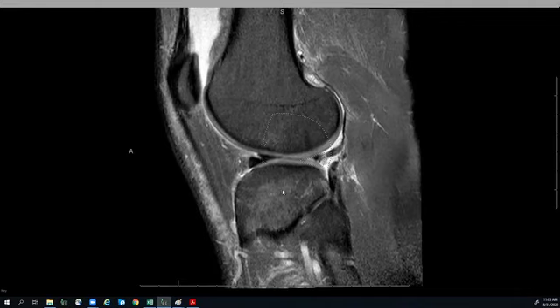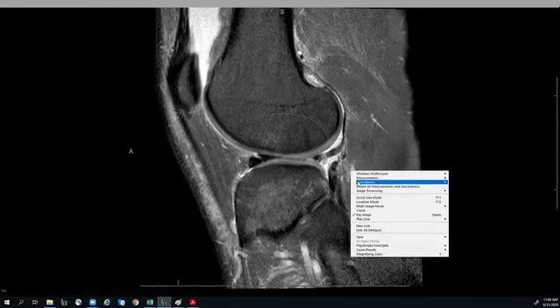Hopefully, the flap tear is more of a complex tear that might be a complication of an oblique tear meeting a radial tear, whereas this flipped meniscus is more of a bucket handle type of tear. I would think about this as more of a bucket handle discussion.